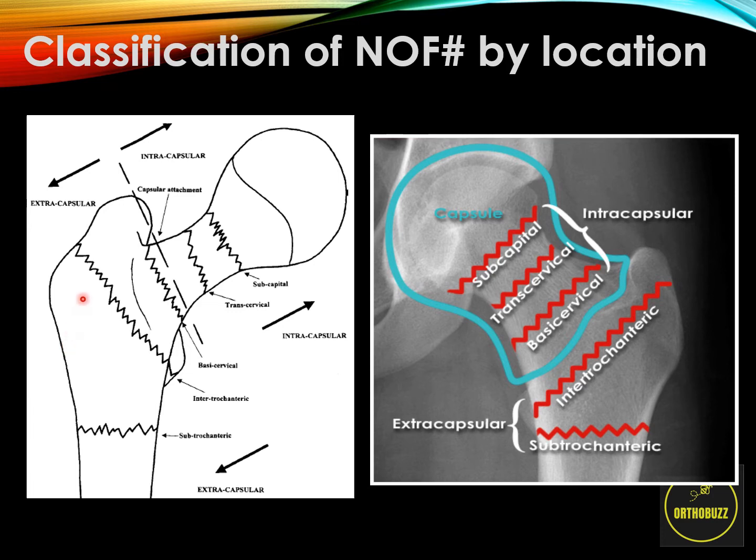The hip capsule is a structure that runs from the rim of the acetabulum and inserts anteriorly at the base of the neck of femur, as depicted here. Posteriorly, it inserts proximally along the femoral neck, and so forms a circle around the femoral neck.